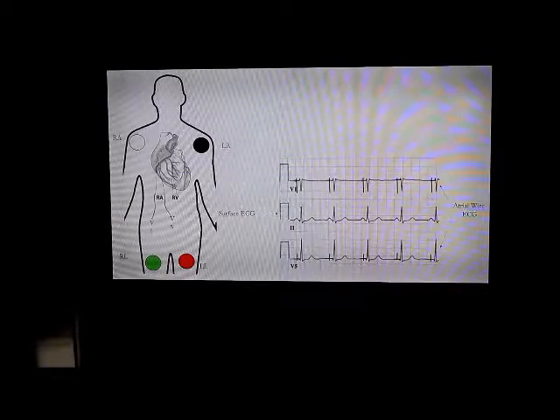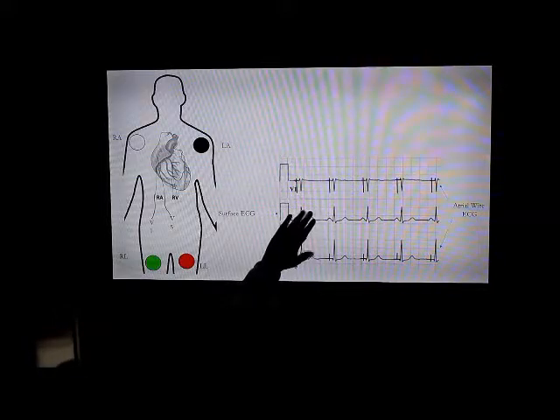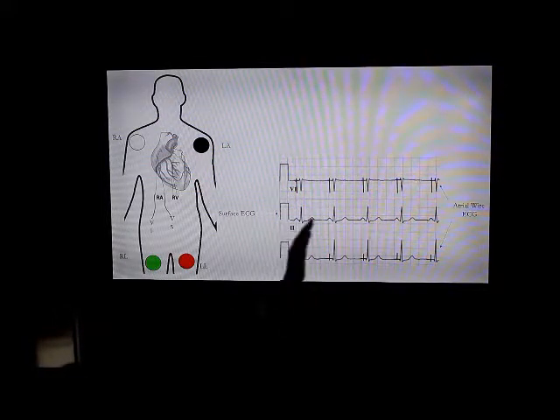So the longest one is the QRS. Meaning if you go up, this is the QRS, and this other one is the atrial spike. If you didn't have this, you would only see this. So is the first one the V and the second one the A, or which one? It's hard to differentiate. But if you have a surface ECG to correlate, then you can know which is the atrial spike and which is the QRS.